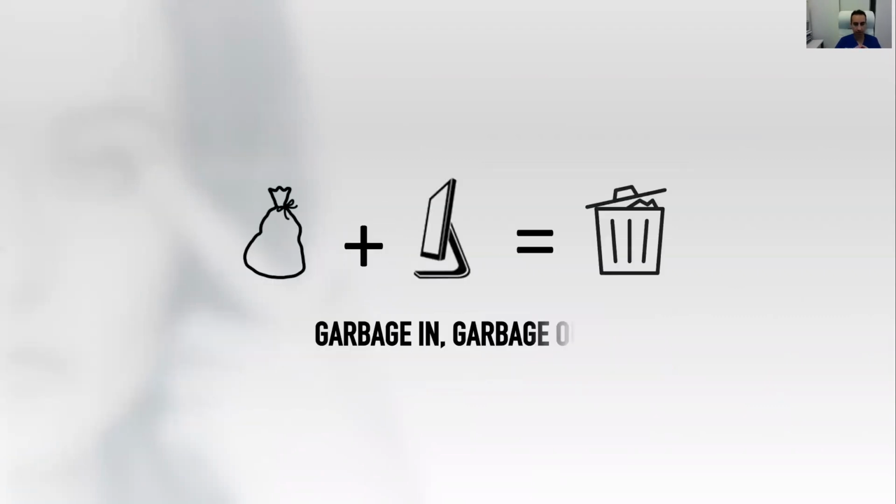And again, garbage in, garbage out. Scheimpflug is great, but in these patients where most likely you have scar and haze, we want OCT technology to give us a better representation of the corneal curvature and the corneal aberrations.